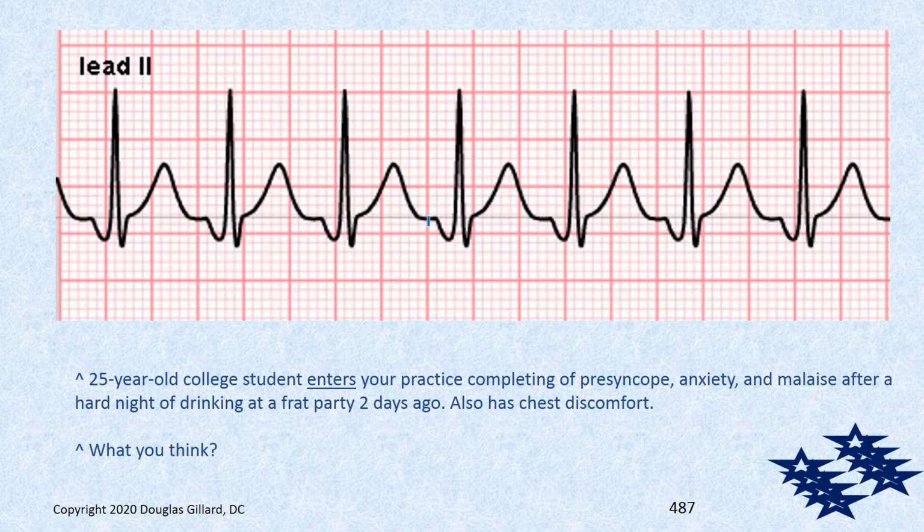But the big thing here that we're worried about right now is this. So now the question is, there's two possible causes of this tachycardia. That's an inverted P wave. What are two conditions that can invert the P wave? Well, a left-sided ectopic focus coming from the left atria. That's EAT, right? What's the other one? Junctional tachycardia. Right? They can both invert the P wave.